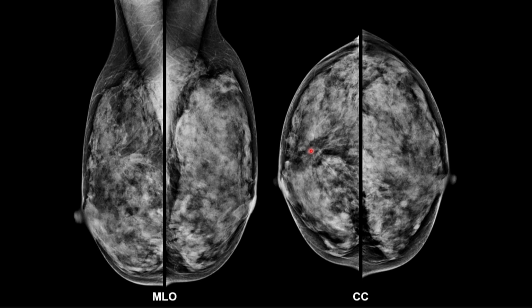Well, I don't have a close-up of it, so I'm not going to be able to tell you much. But the answer is I can't say. I think one of those things you check is whether it is truly distorted white stuff. There are white lines and black lines, and we're more interested in the white lines, but I don't know what you're looking at.